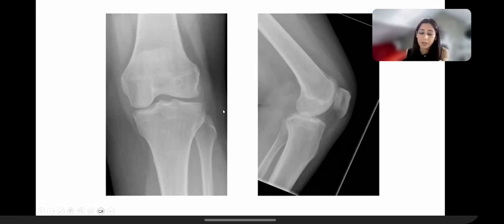Again, as I said, we are a bone sarcoma center. So any bone lesion, they just refer to us, sometimes even without looking at the imaging. So this patient was a known case of tumor, had breast cancer, and was referred to us with this lesion. They were suspecting mets. Now this does not look metastatic.